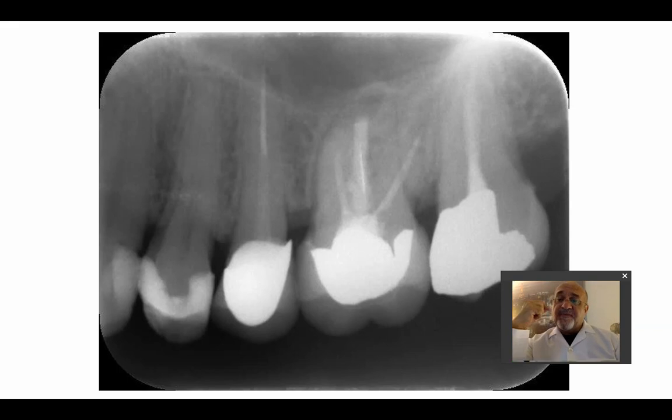And this is why we should always insist on the importance of radiographic anatomy, anatomical landmarks that should be studied and very well mastered, so that we don't mix them with disease.